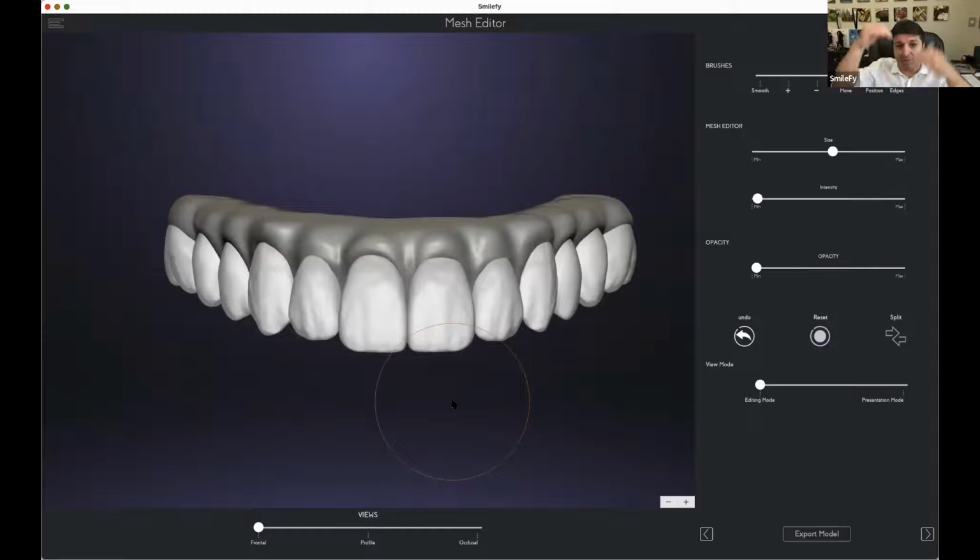You have the position of the implants, you have the holes, and then you can print and try the design in the mouth of the patient, and then you're going to find out what the patient thinks. It's like a mock-up, right? Then you can do the adjustments. If the patient requires some, you can print again, until you have the best solution.